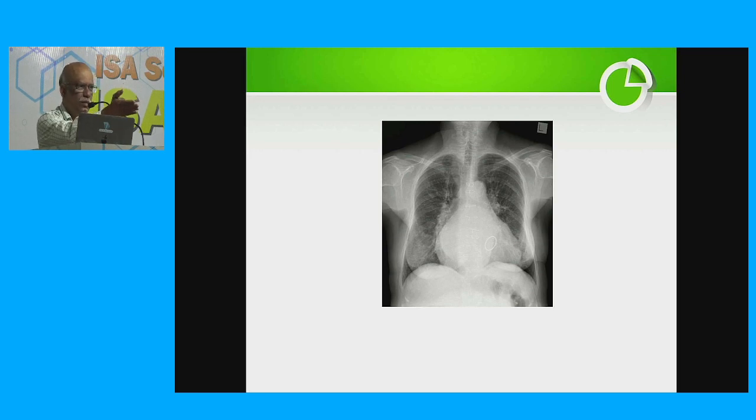Can you just please, Lakeshore Hospital, is it not? Lakeshore, no? Lakeshore female candidate, please. Yeah. Yeah, not. Sir, this is chest X-ray. This is given as a spotter in the exam. What will you tell? PA view. Yeah, louder, mic closer. Okay.